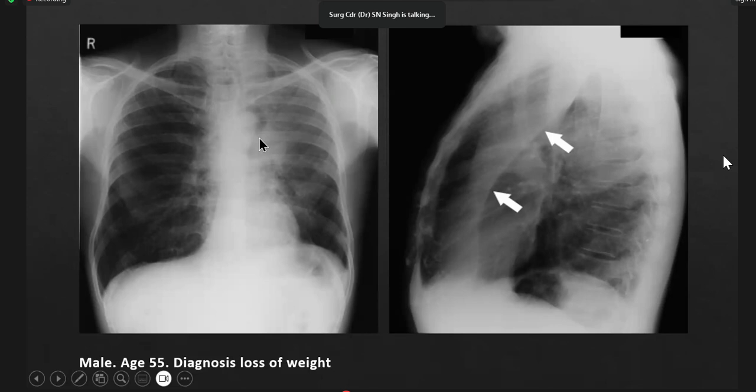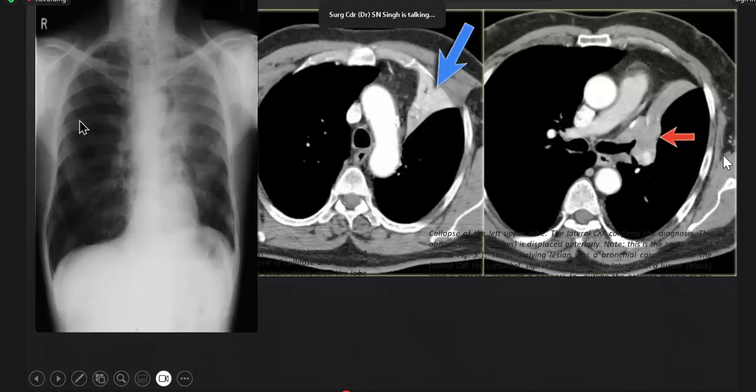The Luft sign. That causes a curve around the aortic knuckle, and this gives the Luftsichel sign on the frontal chest X-ray. Okay. After this, you can follow it up with chest CT. Same thing. This is chest CT.